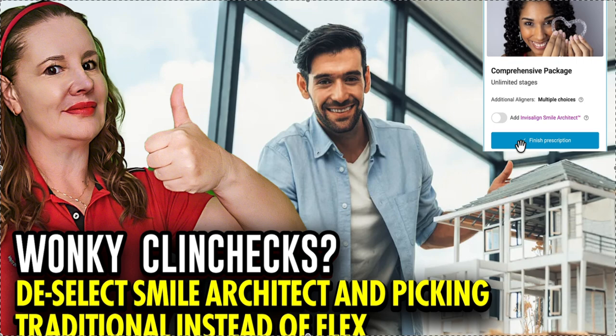When you select Smile Architect in your prescription, you are no longer asking for an orthodontic setup. You are asking for a prosthetically driven orthodontic plan. This relies on a hybrid of AI and human technicians, but the balance of power shifts. Align's proprietary AI handles the initial smile design and analyzes the patient's facial photos and automatically generates a 3D wax up based on the standard aesthetic principles, including incisal edge position, golden proportions, and facial midline. Does it really? Okay. I don't know. There's actually like a source to that, so I guess it does.